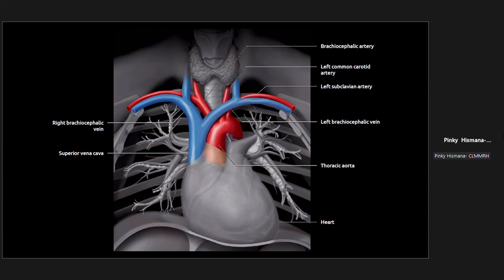If you're a child or if the patient belongs to the pediatric, a neonate, a newborn, you also consider presence of thymus. Part of the upper portion of the thymus also can be seen at the superior or extends into the superior mediastinum. What I'm just trying to say is that when you have enlargement of the superior mediastinum, usually what comes into the mind of the radiologist would be there's a possible pathology going on with the great vessels of the mediastinum.